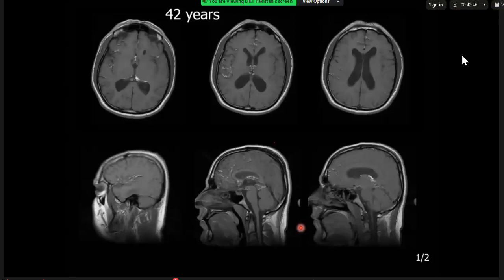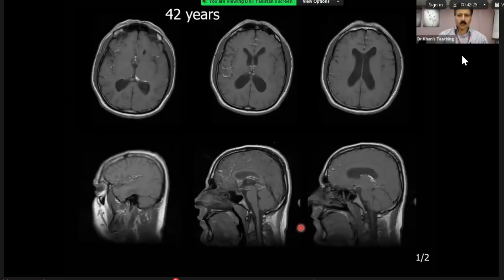So again, this could be blood. Blood will never be, the intensity, a 3-day-old subarachnoid will never survive like this, because it will be very diluted by that time. This could be calcification. No.